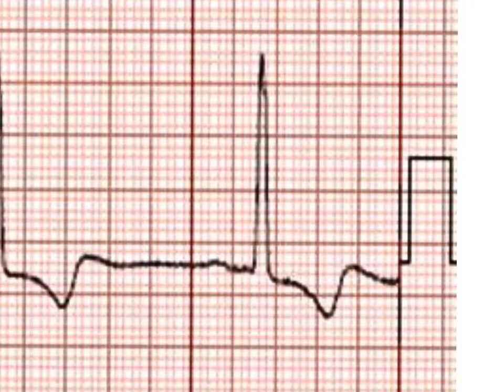Okay, so what am I going to do here? I'm going to do my little pointer. Okay, so here we go. Let's count them. It's a little blurry, I understand, but we have to work with what we have. I have 1, 2, 3, 4, 5, 6, 7, 8, 9, 10. So that does come out to 10 small boxes, which equals 10 millimeters, which equals 1 millivolt in the end.